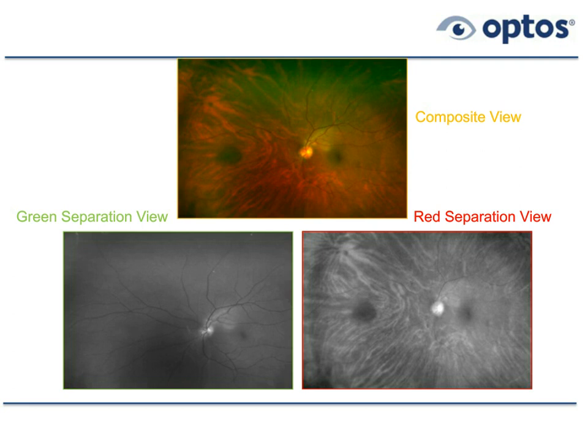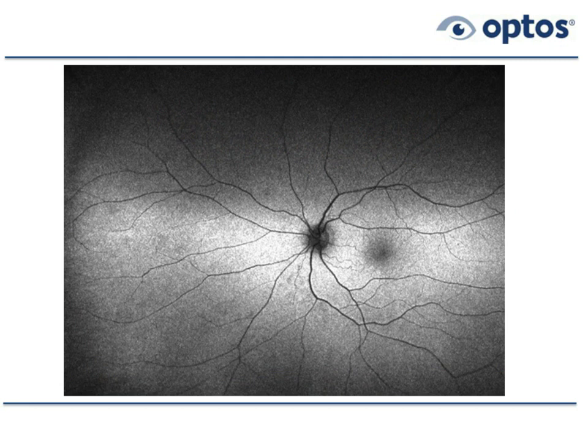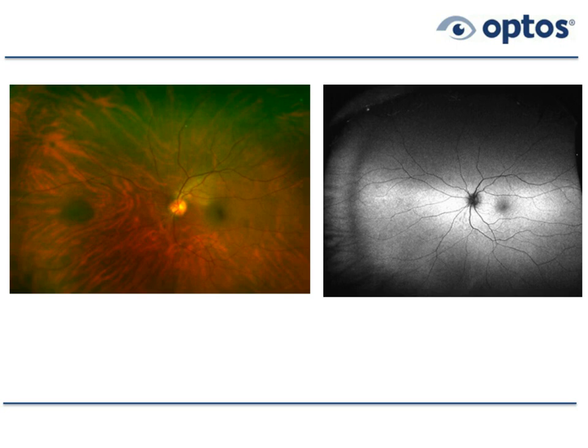We can now look at the autofluorescence of this patient. Again, the vessels are dark, and the disc is dark, and the macula is slightly dark also. In addition to that, we have a subtle granularity. But notice it doesn't show up on autofluorescence. So what does that mean? The autofluorescence is telling us about the retinal pigment epithelium, the integrity of the retinal pigment epithelium. That lesion, we're assuming, we actually gave it a diagnosis. We said it's a choroidal nevus.